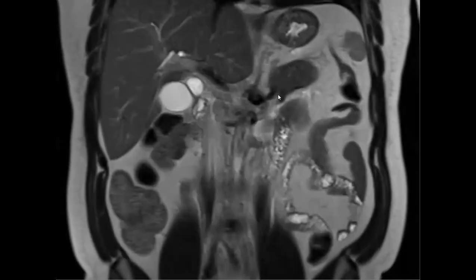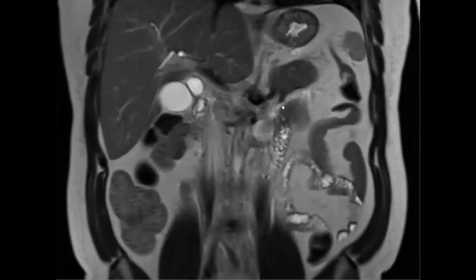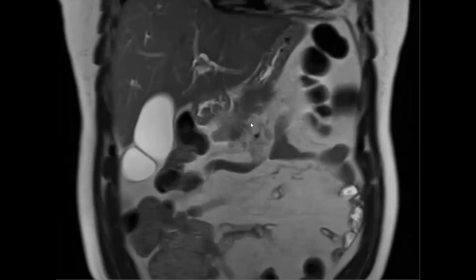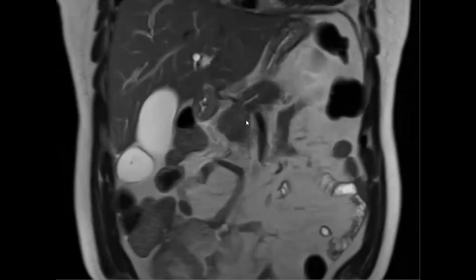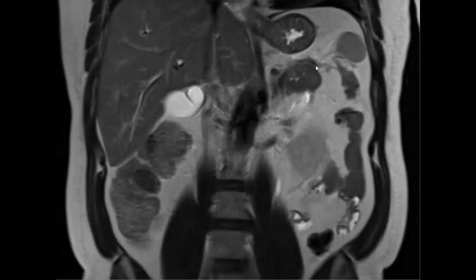So that's like, for Yashant, I don't know if you heard this, but there's a Spanish river that goes both above and below ground. So this is Ivan Pedrosa's sign for when the pancreatic duct comes and goes. It's kind of like the sclerosing cholangitis variant of the pancreatic duct. And then the rest of the pancreas looks sausagey. Little pseudocapsule, like fibrous pseudocapsule here.